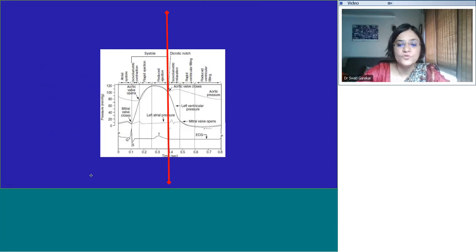I keep having to move the video box, alright. So again in detail, because all of diastology is about this, this bar marks where ventricular diastole starts at the end of the T wave. You've got the aortic valve closing.